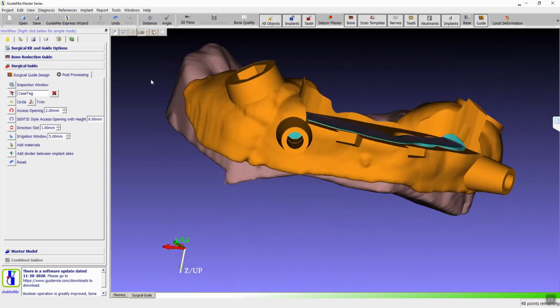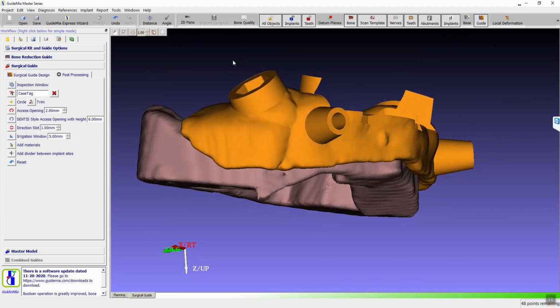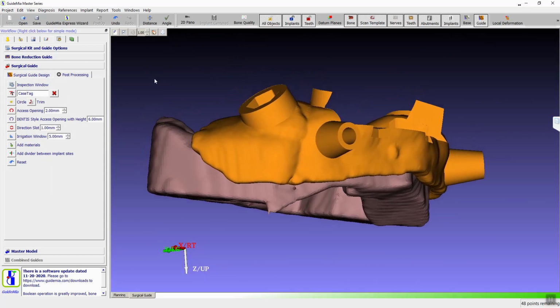Let's say you go here, you can write text here. Sometimes our clients put a number there or just a patient's name, it doesn't matter. Let's say we put Jimmy here, for example. You put it on here, and you can rotate this.